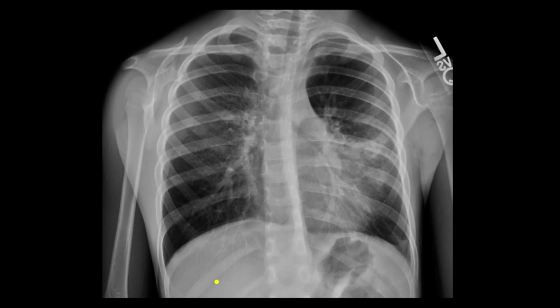So in this patient now we're going to look at the left heart border, and so when we're here we have the aortic arch and we're following it down, and suddenly your left heart border has disappeared, and you can see that there's a patchy infiltrate here, sort of irregular increased density just adjacent to the left hilum. And then when we come more distally again, we're seeing the left hemidiaphragm contour. So this is characteristic of lingula consolidation, so consolidation within the lingular lobe. So again, the silhouette sign is very useful in these cases to determine exactly where the consolidation is.